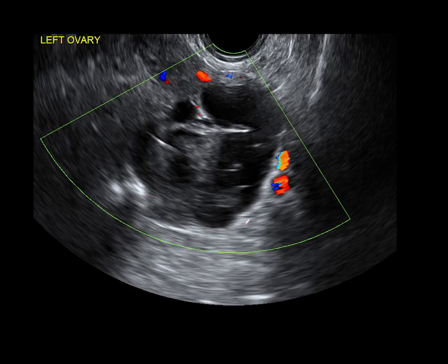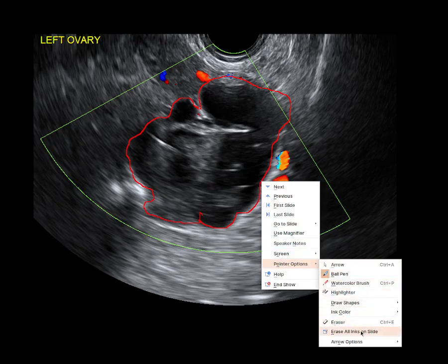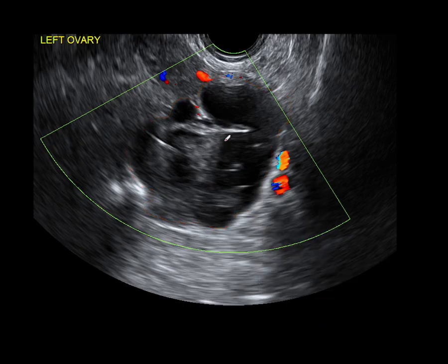Now, they're not always as easy as that, of course. Here's a patient with a slightly lobulated border, but it's very, very difficult. I'm not going to say this is very convincing for a lobulated border, but perhaps you might agree once I've outlined it like this. This is a sort of pattern which is often seen actually in endometriosis or in a patient with previous pelvic inflammatory disease, where fallopian tubes are pulled in and mixed up together with ovarian stroma, and it can be very difficult to evaluate.